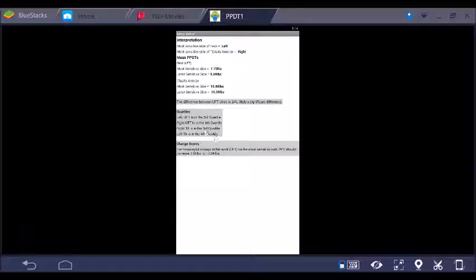Same thing can be said for the tibialis anterior, where the right is in the 3rd quartile and the left is in the 4th quartile. So they're all sort of in the upper 50% of all the tests of people that we have also tested with neck pain. So in this case, the person really isn't all that sensitive.